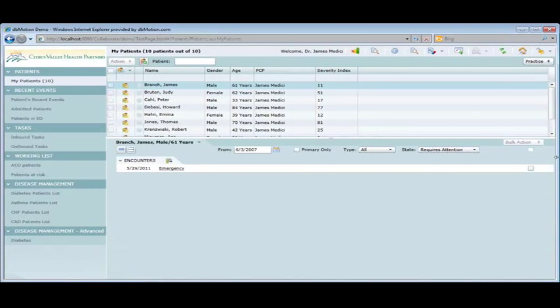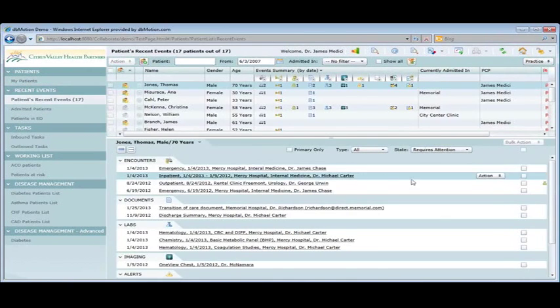So let me reorient you to what you're seeing. This is a pretty big departure from, I think, how we typically look at data. No matter what, we're still stuck in the world of pulling one chart and looking at one patient's piece of data. The idea is, how do we look at populations of patients prospectively and retrospectively for analytics, for population health management, et cetera.